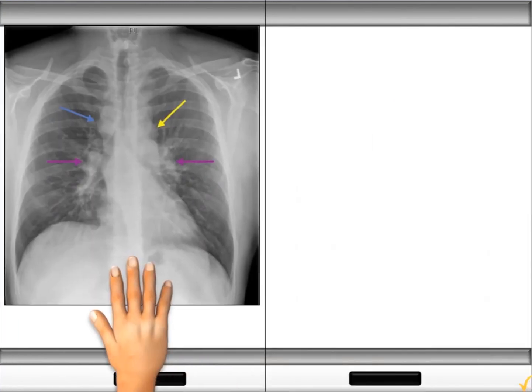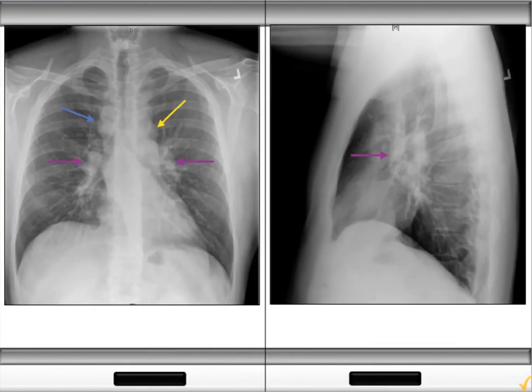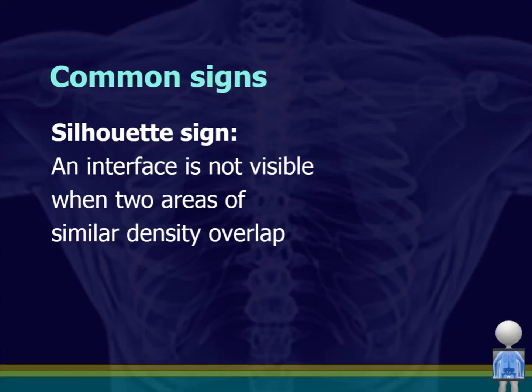So again, let's throw that up on our film here, on our light box, and we'll look at what air bronchograms look like in this case. Normally you can see the trachea and the bronchus, but do you see how much better defined they are on the background of all the local inflammation that's occurring here in this picture? Same thing here. Here you can see the bronchogram as well. So there's the trachea and across. So just look for that and understand that it means that maybe there's some local inflammation. Clinically, obviously, correlate that.